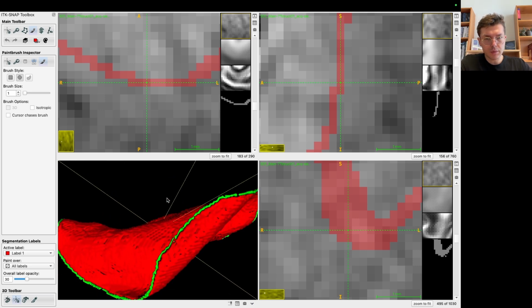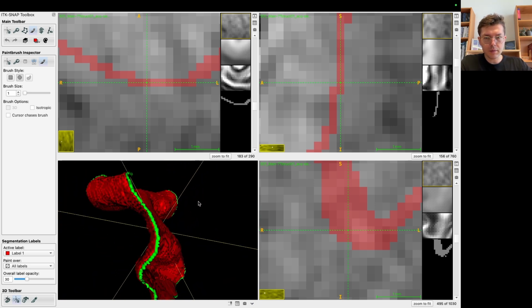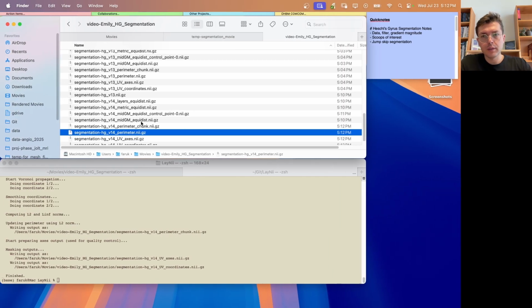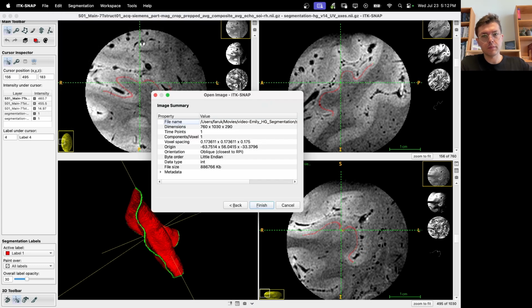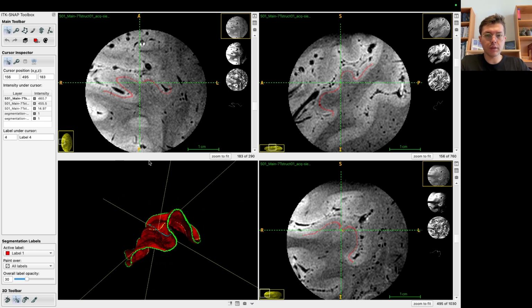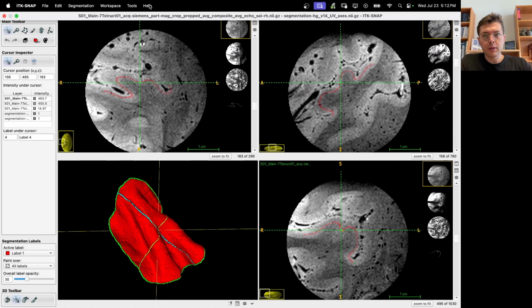Okay, nice continuous line all around. I think it might have worked here. Okay. Let's have a look at the UV axis. Yes. See, now you really feel that they are 90 degrees to each other, geodesically. It worked. Okay. Now let's have a look at the perimeter chunk.